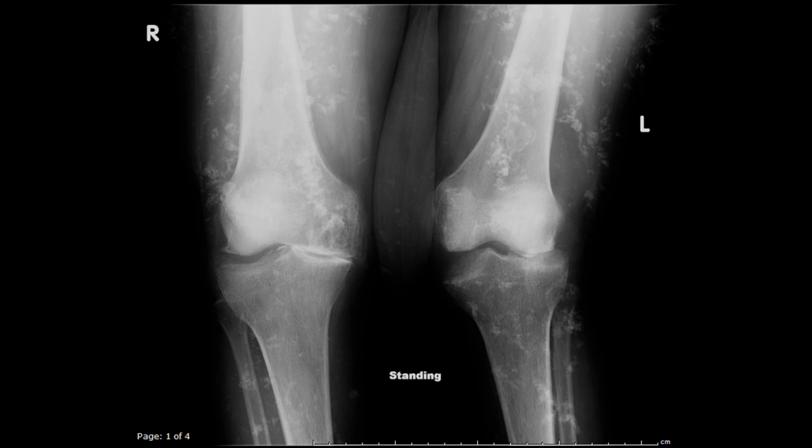Similar to the one in scleroderma, where you have systemic calcifications, in dermatomyositis will be more common at the proximal thighs or proximal muscle groups, like the MRI that the rheumatologists order. And again, it's a dystrophic calcification. It's caused because of the diffuse myositis and inflammation of the soft tissues that end up dying and calcifying.